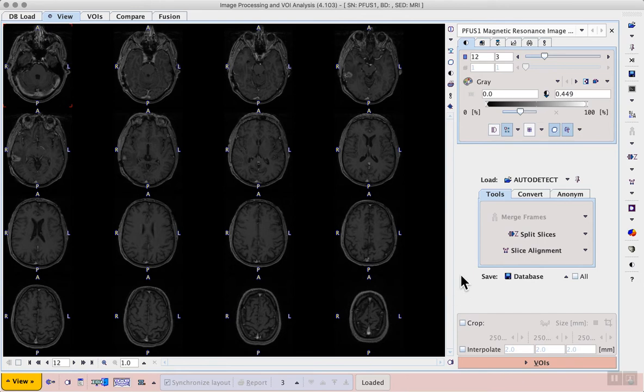Next, we can use the capture icon in the lower right corner of the image display, where we can select Capture Display. Here it also hints that there is a keyboard shortcut, Ctrl E, that will help us make these display captures.